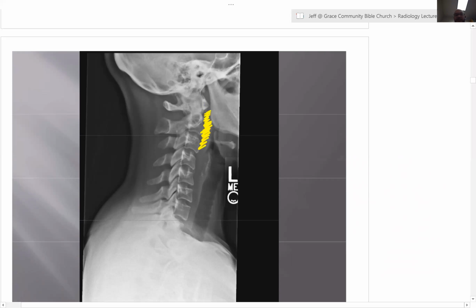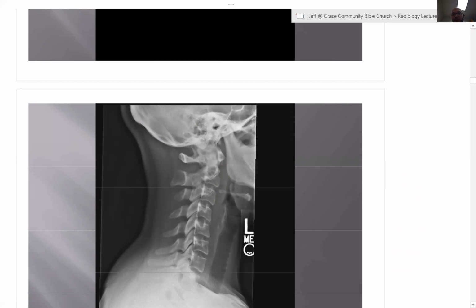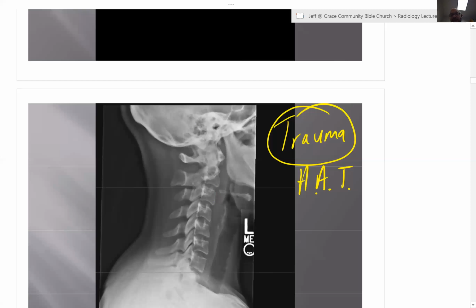And again, here is hemorrhage, abscess, tumor. Well, let me give you a history here. There's a history of trauma, in this case, a car accident, a pretty bad MVA. All right, put this all together, docs. You have a big retropharyngeal soft tissue space. You've got rotation that's real of C1 on C2. What do you think the best diagnosis is once we've now identified the findings and we've described them?